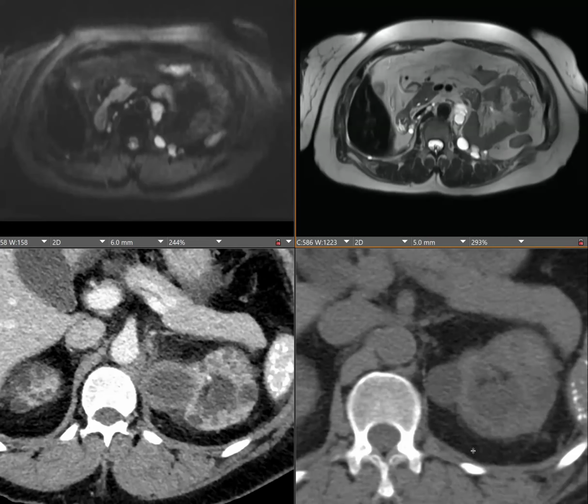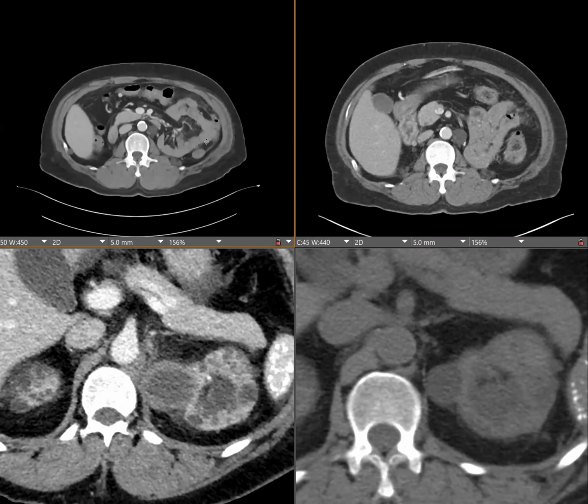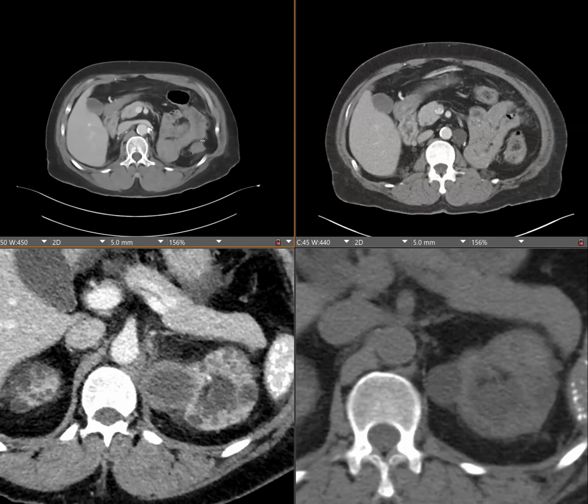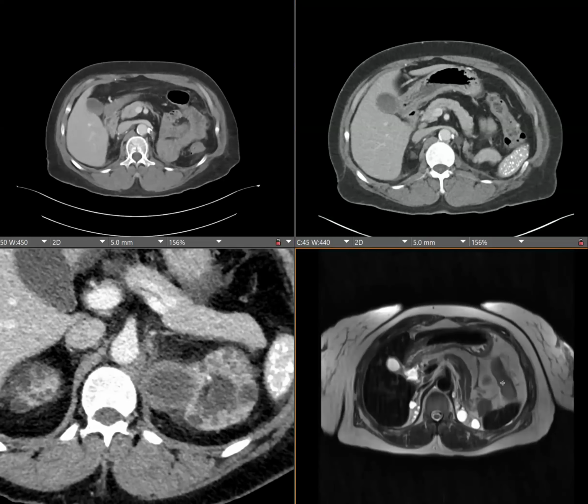That'd be weird for lymphangioma. They were increasing in number and size. Maybe I'll pull up one more MR or CT. This actually reminds me of, and in this paper they talk about von Hippel-Lindau related ones. In von Hippel-Lindau, it's thought that most of the cysts are actually cystic neoplasms that are lined with tumor cells, but they look completely cystic. So I wonder if that's what these cysts are. They look super cystic, but they're lined with a thin layer of tumor cells.